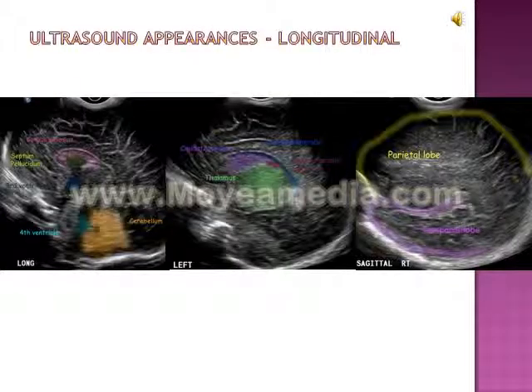This slide highlights important neonate brain anatomy in longitudinal views. Midline longitudinal identifies many useful landmarks. The cerebellum, in orange, shows up as an echogenic structure in the posterior fossa. The fourth ventricle, shown in light blue, sits in front of this. The cisterna magna sits below the cerebellum and is not very echogenic. The corpus callosum in pink is seen sweeping from anterior to posterior with the cingulate gyrus above and parallel to it. The parieto-occipital sulcus is seen well above the posterior fossa.